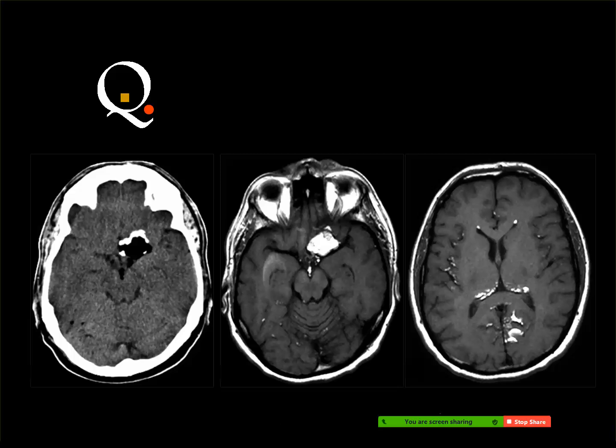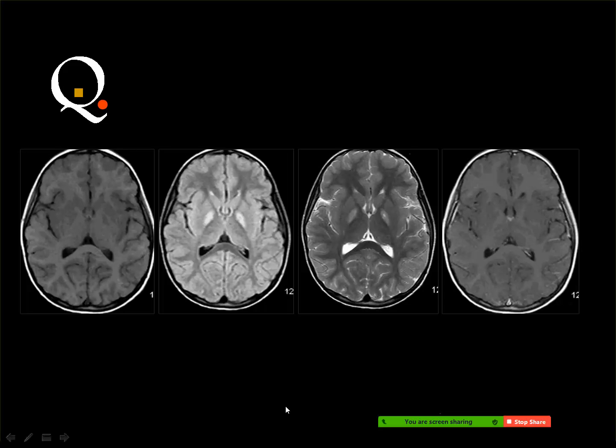Dermoid. Dermoid. Yes, and you should say with seeding, yes, with leakage in the subarachnoid space and maybe inside the ventricles as well. The lesion showed fat density in the CT with marginal calcification, and it shows high signal in the T1, denoting the presence of fat. And you can see also fat globules scattered throughout the subarachnoid space.